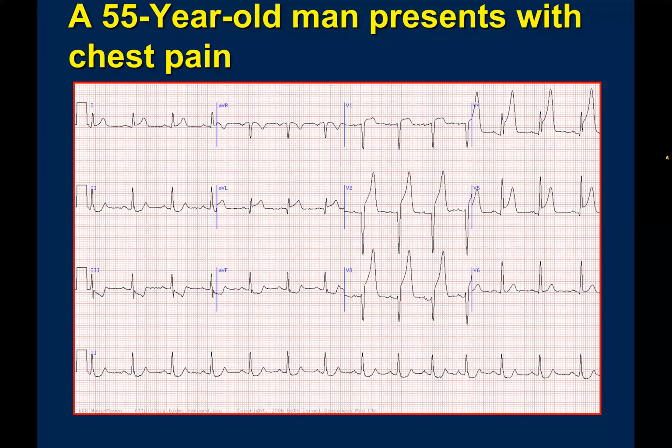Two differential diagnoses generally are hyperkalemia or ischemia. And if you have ST segment elevation, hyperacute T waves go, of course, with myocardial infarction, as you mentioned. So it's excellent. But how about lead 1 and AVL? What do you think of them? Leads 1 and AVL are the high lateral leads, and they also have ST segment elevation. I did not notice. This patient has anterior and lateral.